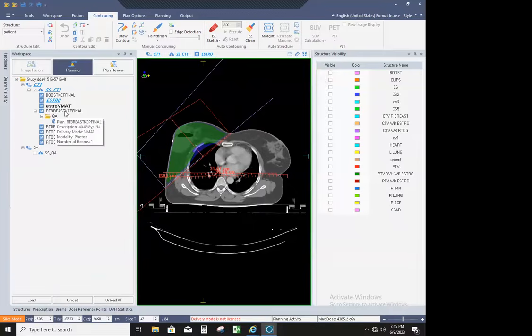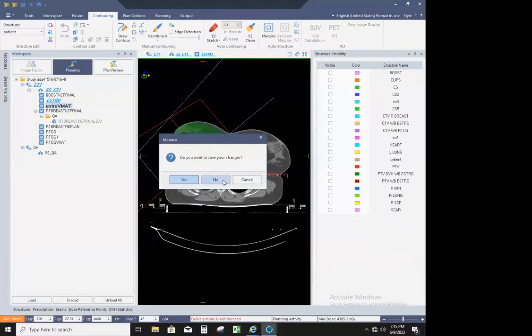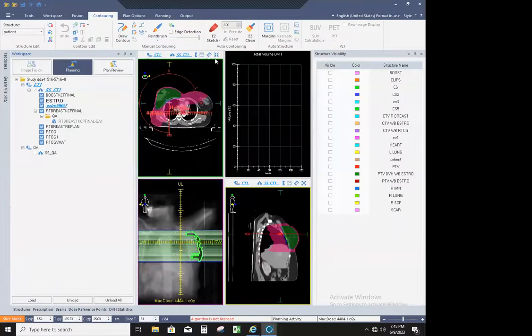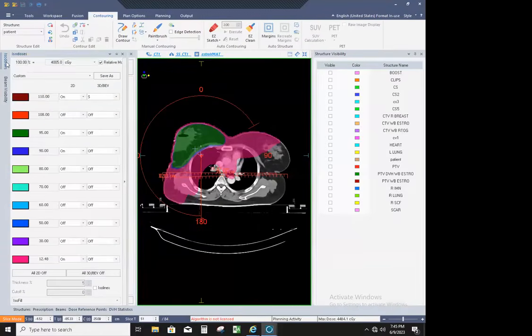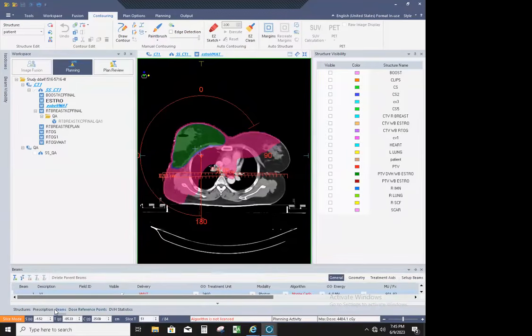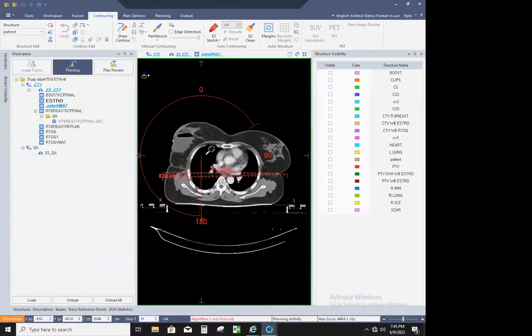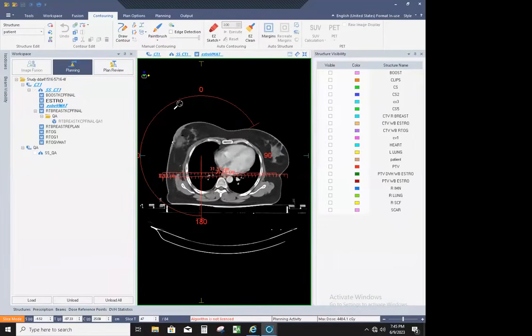And if you want to see the VMAT plan, this is the VMAT plan we can see here, but don't go for a full arc, partial arc is better, a medial partial arc and a lateral partial arc.